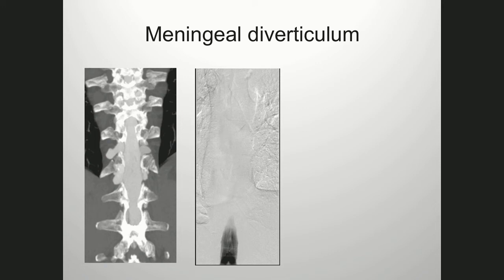Another patient with multiple meningeal diverticula. This presents a problem if permanent fix is required and surgery is contemplated. Where and how do you treat? Which one do you treat? Level selection becomes important. This patient had large ones in the thoracolumbar junction, but some in the upper thoracic spine.